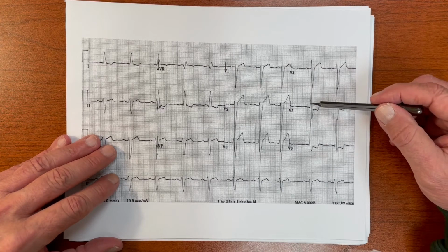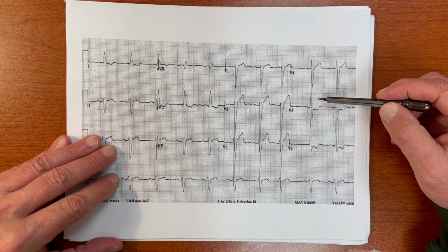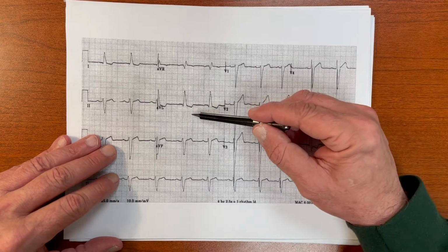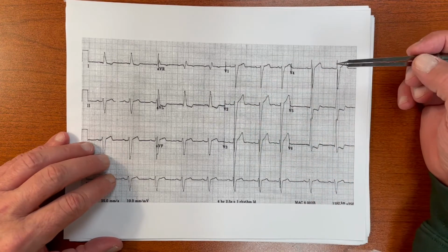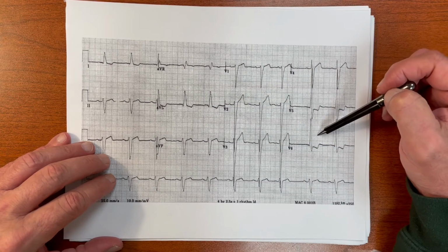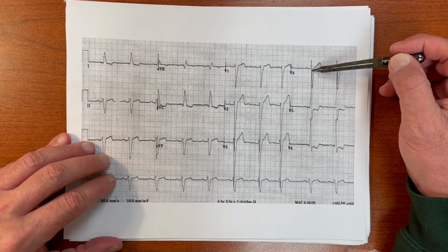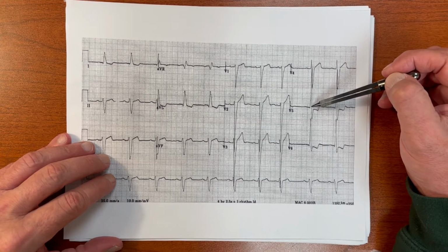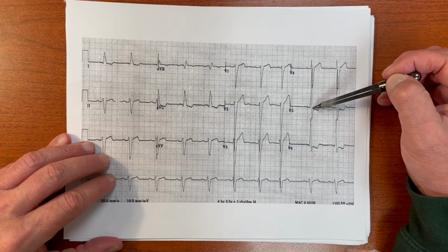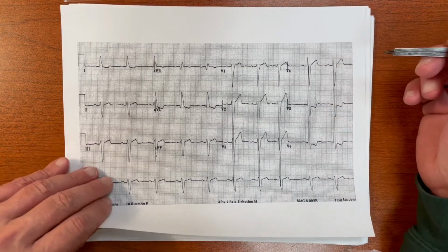And we said we have all this voltage, and look at the ST segment. The T wave is not pointing up where it should, the ST segment's down, T wave pointing down. Okay, so that is abnormal, but does that mean ischemia? No, this happens to be a normal change due to the LVH. Just like you had an abnormality in depolarization, that is the hypertrophy, that gave you a secondary change in repolarization. So that doesn't get an ischemic read, okay?